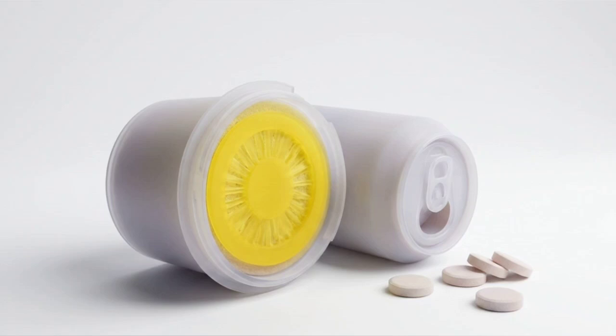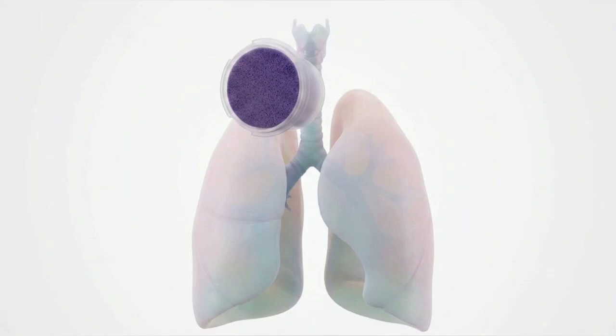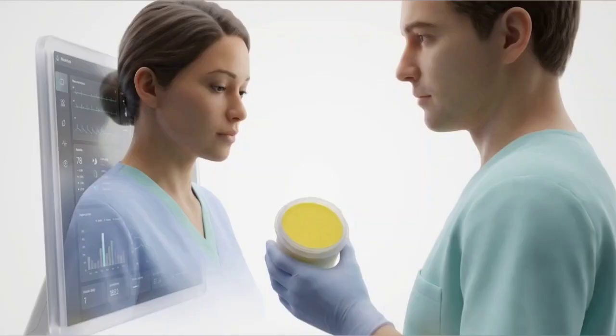Because this relies on basic chemistry, it has vulnerabilities. Ingested antacids or carbonated drinks can create a false positive by chemically mimicking an acidic exhalation. Conversely, a low tidal volume or severely compromised lung perfusion can result in a false negative. Understanding these underlying physics prevents the provider from being misled by equipment artifacts or chemical false readings.